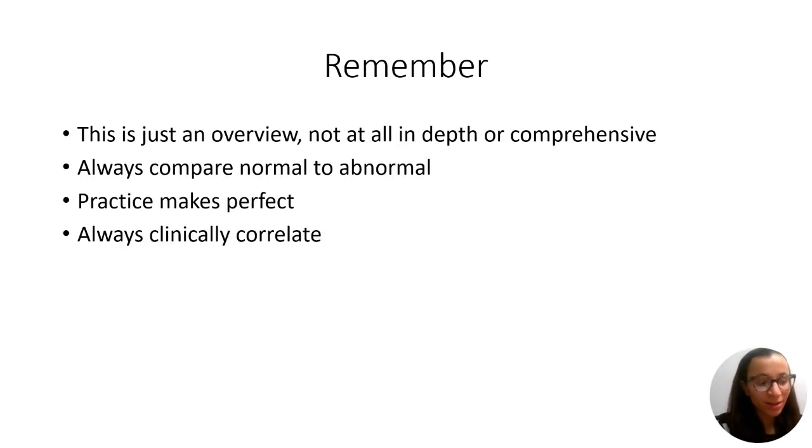Before I summarize, I just want to say that I'm not a radiologist, and I'm not claiming to be one either. Obviously, a radiologist has a much more comprehensive, in-depth way of doing it. This is just how I look at it really quick, on the surface. I go through the blood, which can be very bad. Blood is bright white. I look at the cisterns, I look at the brain in terms of differentiation and midline shift, I look at the ventricles, and then I look at the bone for any fracture, etc. That's the way I do it, a really quick, not comprehensive review of a CT head.